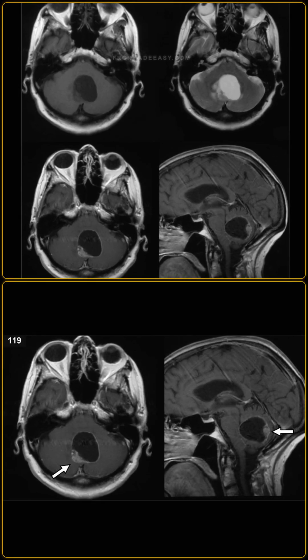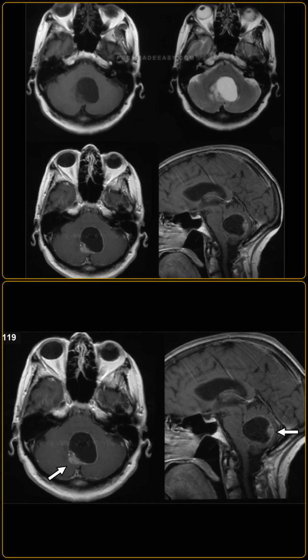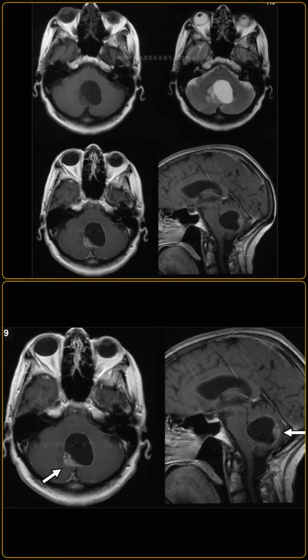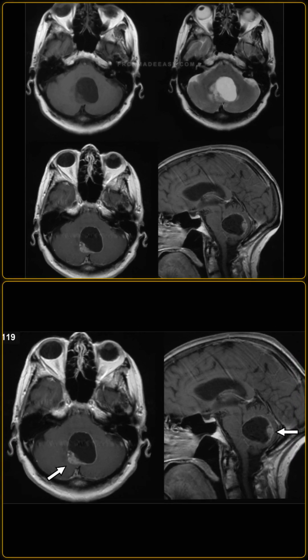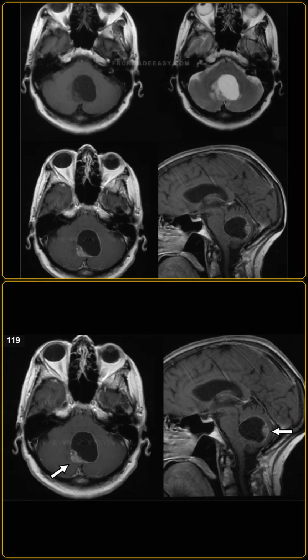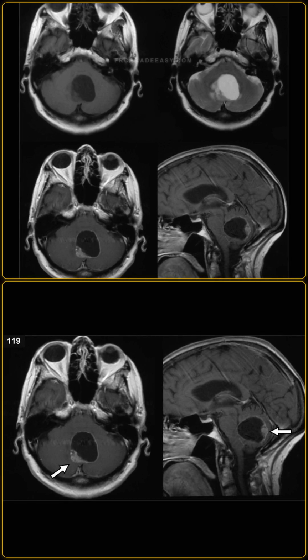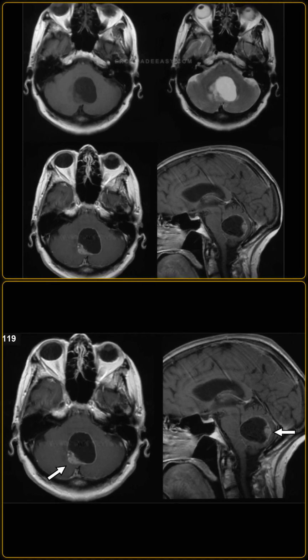Okay. The diagnosis is a cerebellar hemangioblastoma. The differential diagnosis includes a juvenile pilocytic astrocytoma, a solitary cerebellar metastasis, and an atypical medulloblastoma. A juvenile pilocytic astrocytoma is the most common infratentorial tumor in pediatric patients, showing an identical cystic component and an enhancing mural nodule. Cerebellar metastases should always be considered in older patients, whereas medulloblastomas typically present in children as midline fourth ventricle lesions.